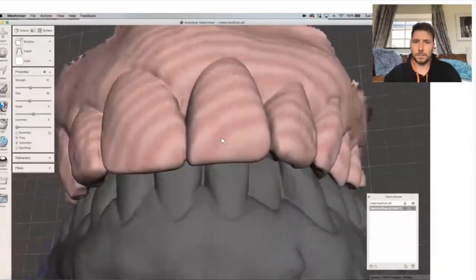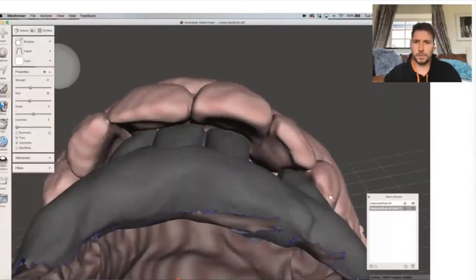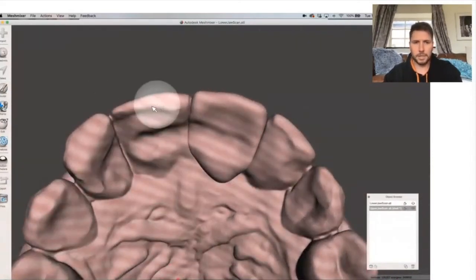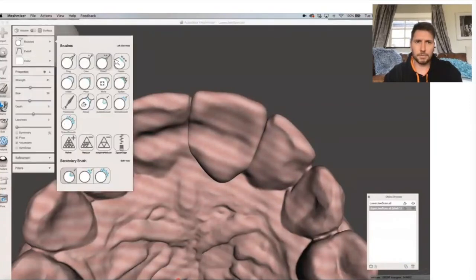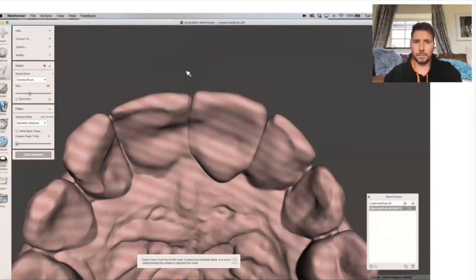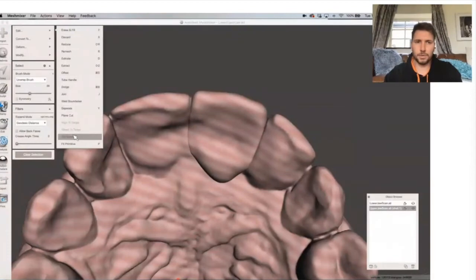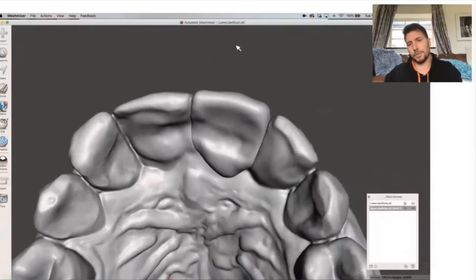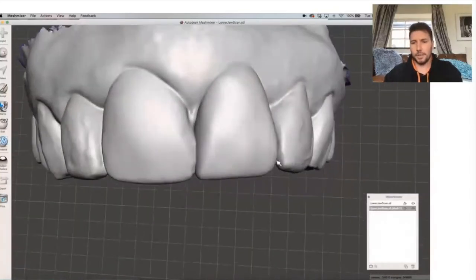Okay, good. So now we have a new tooth. Check the occlusion. We can turn the lower off. See, it's indented there where that is. I might just flatten those little bits. Sculpt. There we go. And then we'll send it back around again. So selecting all, flip normals, and there we go. So now we've got a new tooth. We're adjusted for the occlusion, and it's there. Okay, so let's just check.